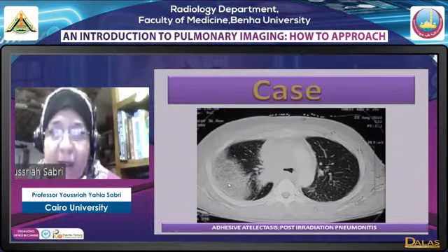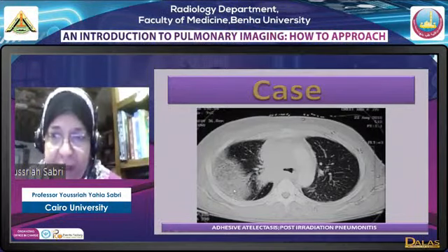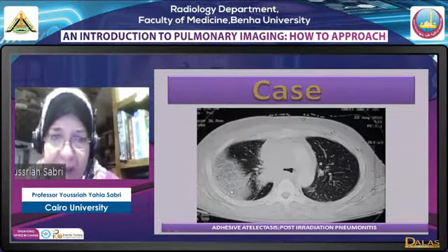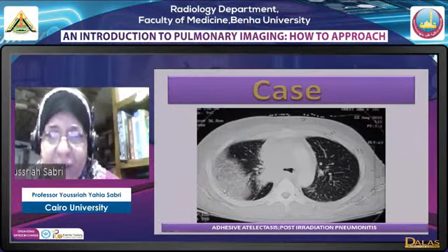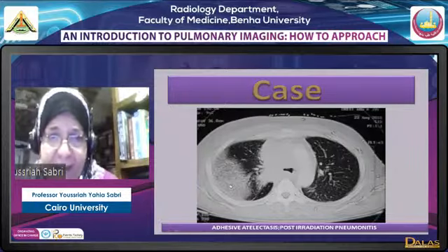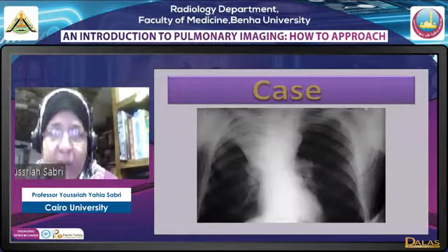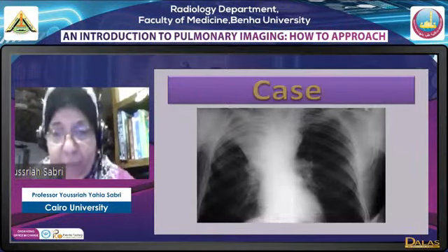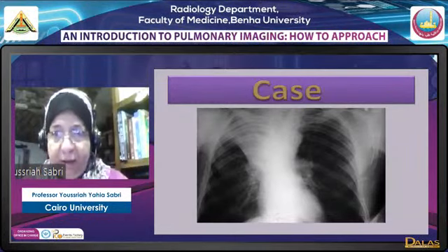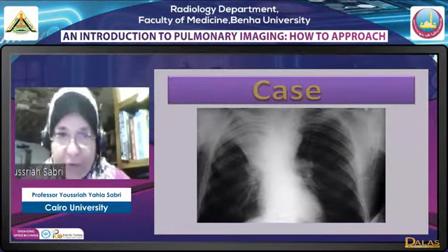This is number one. It is seen peripheral in location in the lesion, as in the lobe. This is number two. Actually, it looks like consolidation. However, pathologically, it is adhesive atelectasis. There are the four types of collapse: cicatricial, resorption, relaxation, and adhesive type. Now we come to an important item: how does lobar collapse look like? This is an important item, and it's actually sort of spotting.